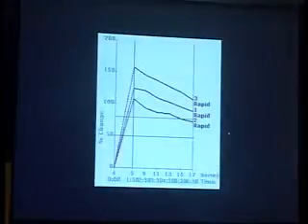What's abnormal? Side 1 or side 2? 2. Okay, what's going on? Lobular carcinoma, maybe a lymphadenopathy here. Okay, all this is a constellation of the side. This is the subtraction. I just want to show you these, which we haven't seen yet.